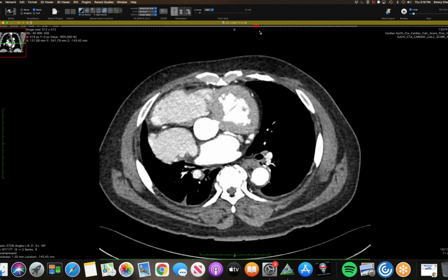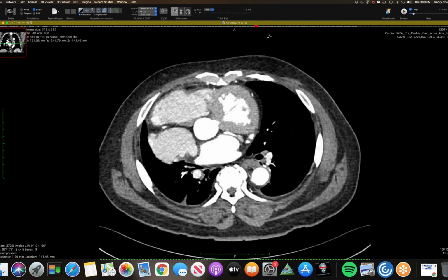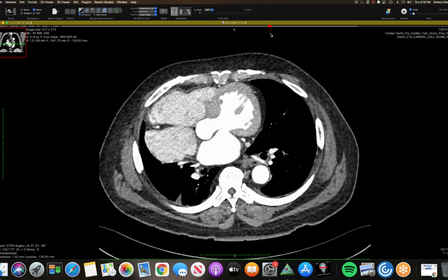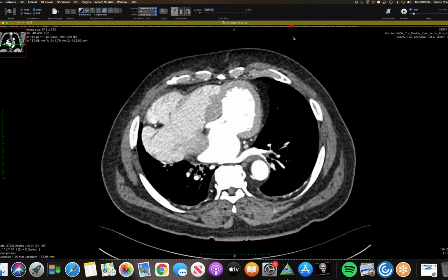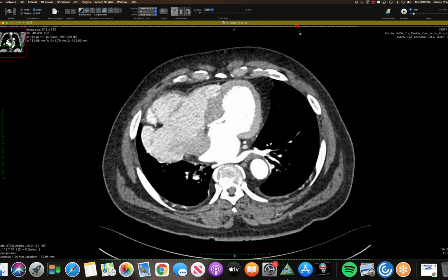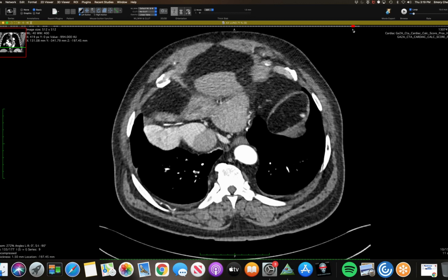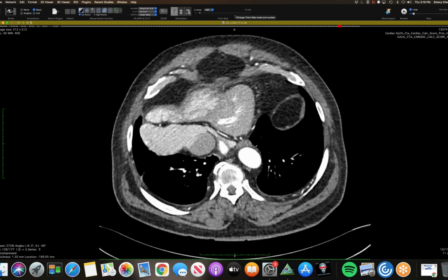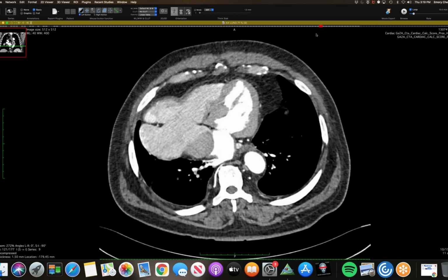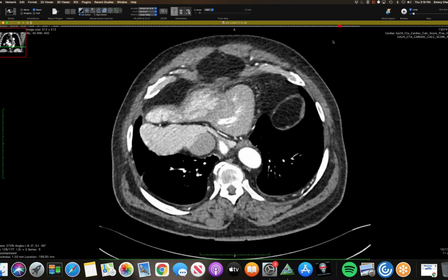But Oz and Art, they both suggested that this could be his chest pain, because they looked up and there are case reports of this type of herniation causing dynamic torsion and potentially occlusion of the coronary there. So their idea was that this might be some occlusive stenosis or dynamic stenosis of this RCA there. Unfortunately, we didn't have more than one phase because it was just prospective.